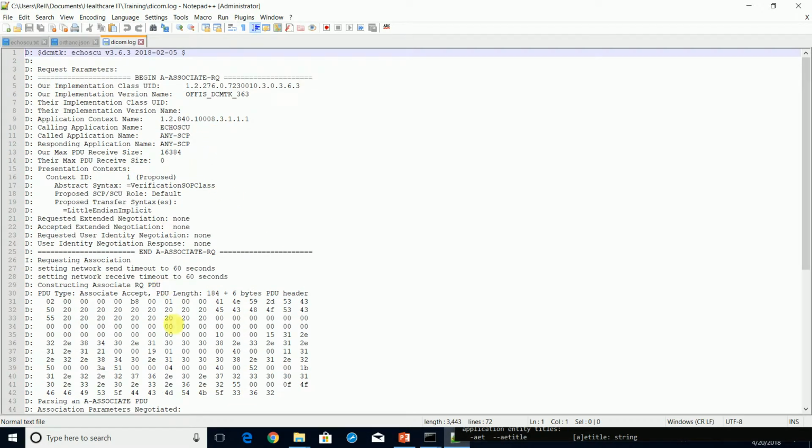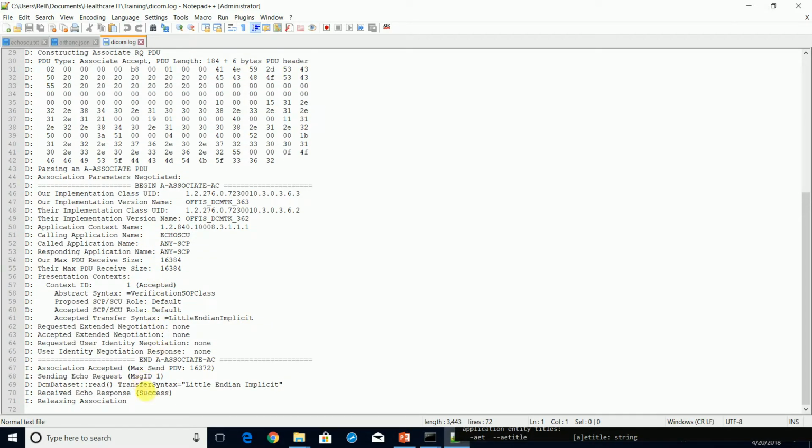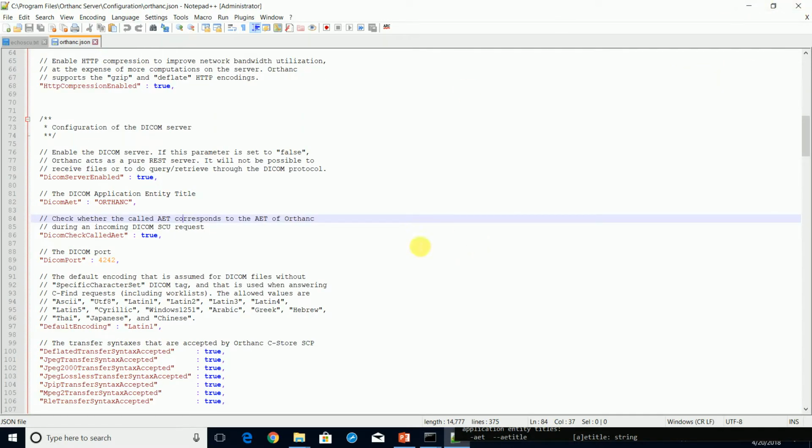Oh, so it looks like it still accepted the association. Accepted, success. All right, I'm trying to get it to fail. So let's see.